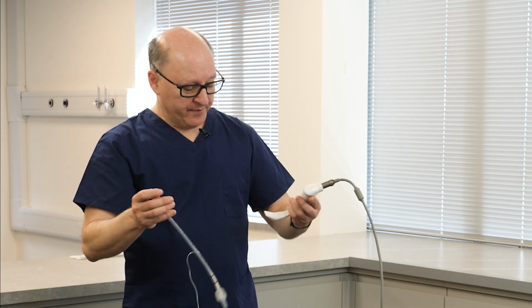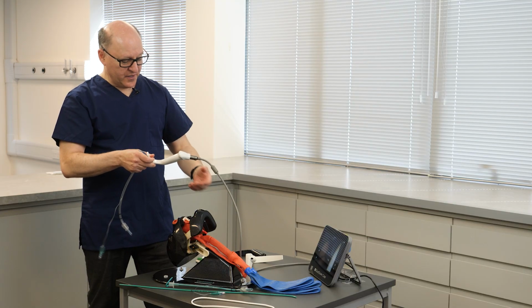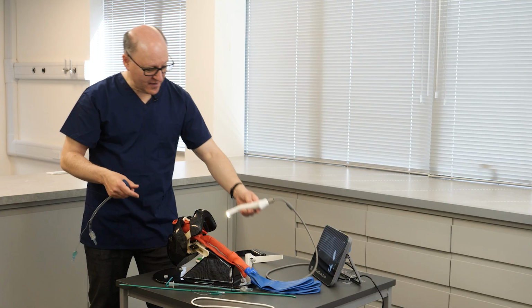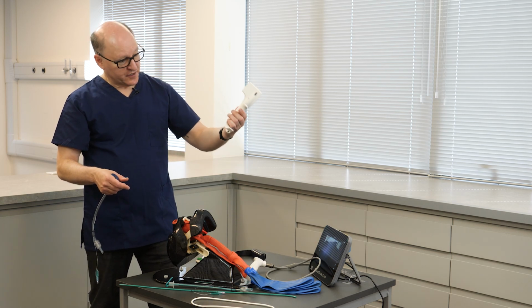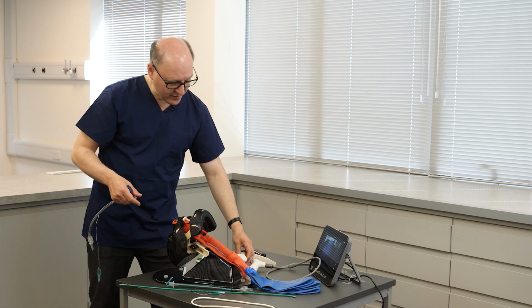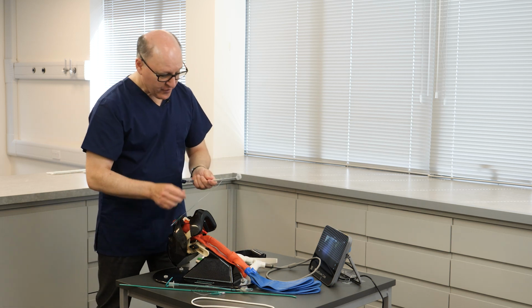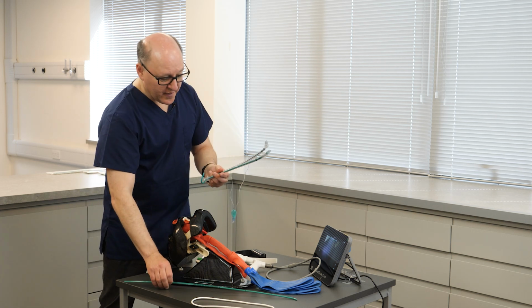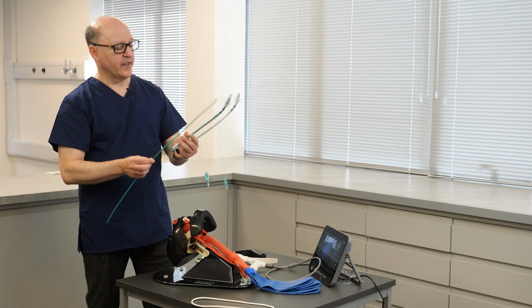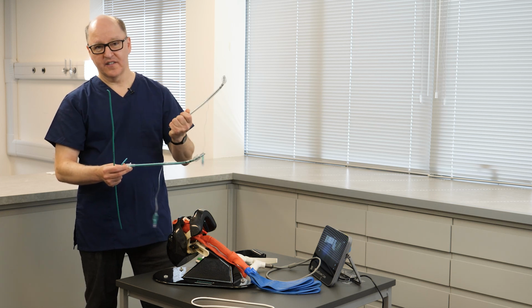So in summary, with the development of direct laryngoscopy, hyperangulated video laryngoscopy, and with self-contained, conventional shape Macintosh video laryngoscopy, we have, over the years, acquired 3 different devices to assist with tube delivery: the bougie, the malleable stylet, and a rigid hyperangulated stylet.